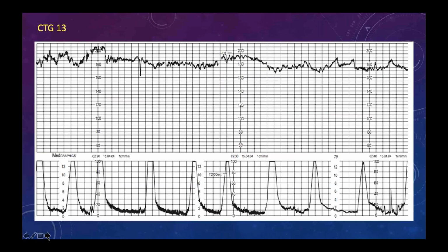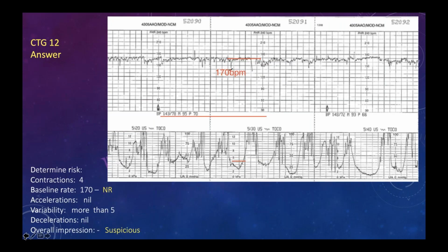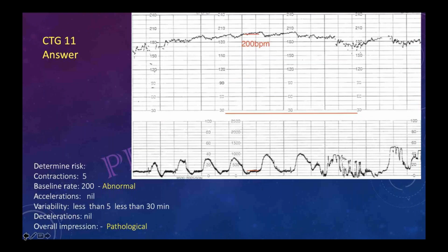Thank you. Now, hello, ma'am. I have a question. Ma'am, previous CTG, please. Can you explain, ma'am, the last CTG, how we can count the contractions? You said that in 10 minutes you can count the contractions in this CTG graph. How can we count? Can you explain?